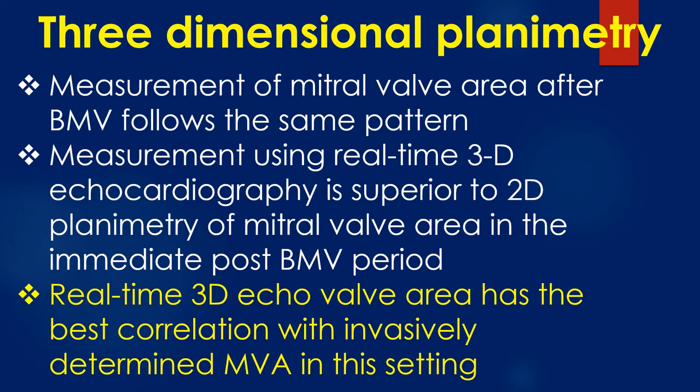Measurement of mitral valve area after balloon mitral valvotomy follows the same pattern. Measurement using real-time 3D echocardiography is superior to 2D planimetry of mitral valve area in the immediate post-mitral valvotomy period. Real-time 3D echocardiographic valve area has the best correlation with invasively determined mitral valve area in this setting.